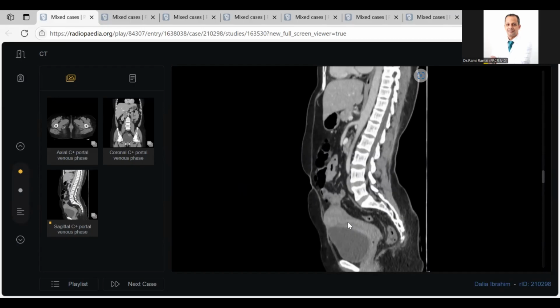You did very well when you told me you will wait for the delayed scan. And if the patient has no time, we can do ascending cystography. The contrast will be retrograded from the bladder through the fistula, then into the uterus and down.